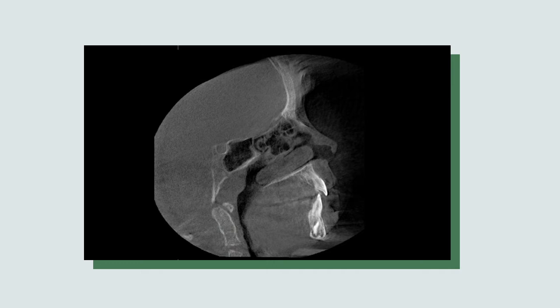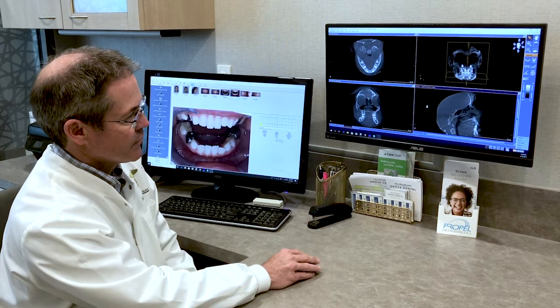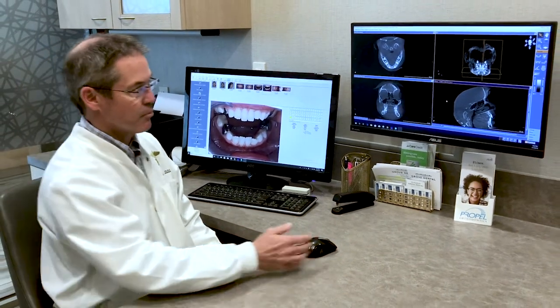As I start to move this to the side a little bit, all of a sudden we see the airway closing off where the tonsils are big. So I can already see from there that she could easily be having airway issues that cause her to snore and sleep with her mouth open at night just to be able to breathe.